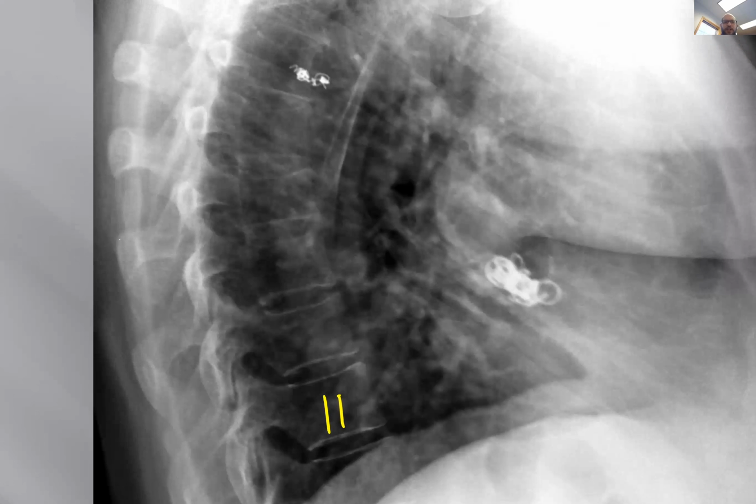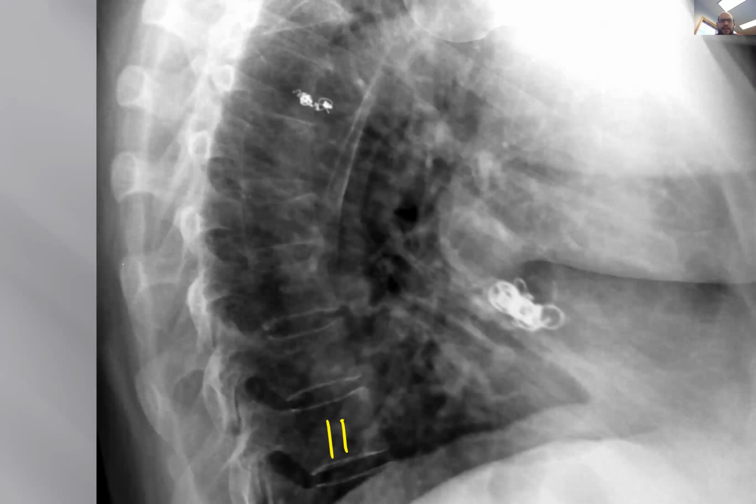Okay, so look at the spinal column. Look at the vertebral bodies on this lateral thoracic view, and I want you to try to pick, if that's T11, which segment looks abnormal to you. So go ahead and unmute yourself and shout out a detection of what level. You don't have to tell me what it is even, but just tell me what level you think is abnormal.